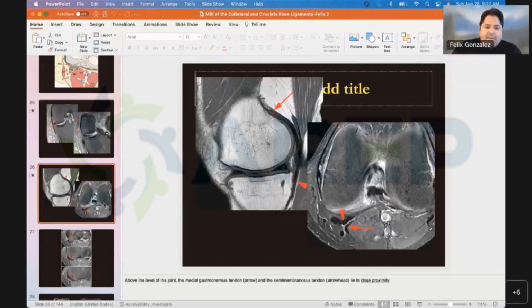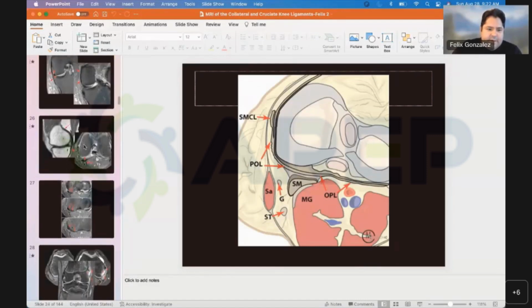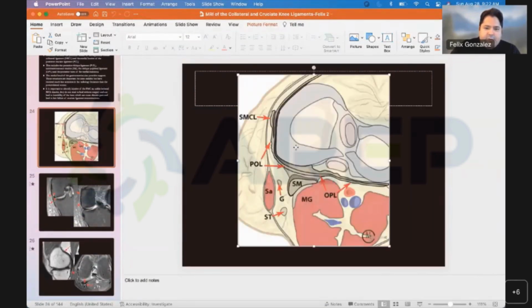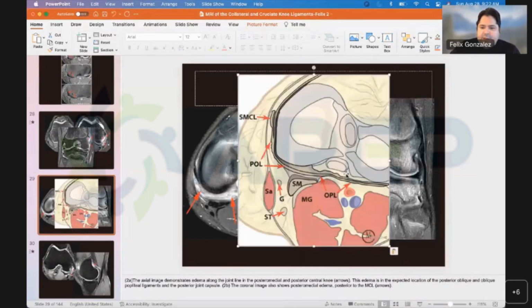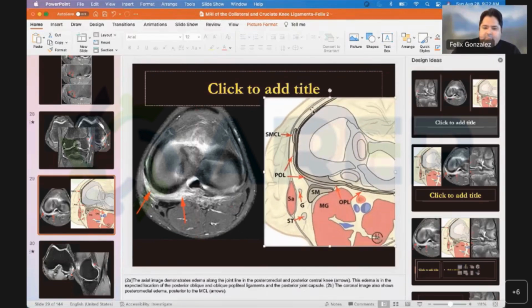So you will have a situation, here it is. Just to show you this, perhaps if we have it next to each other, you see it a little better.